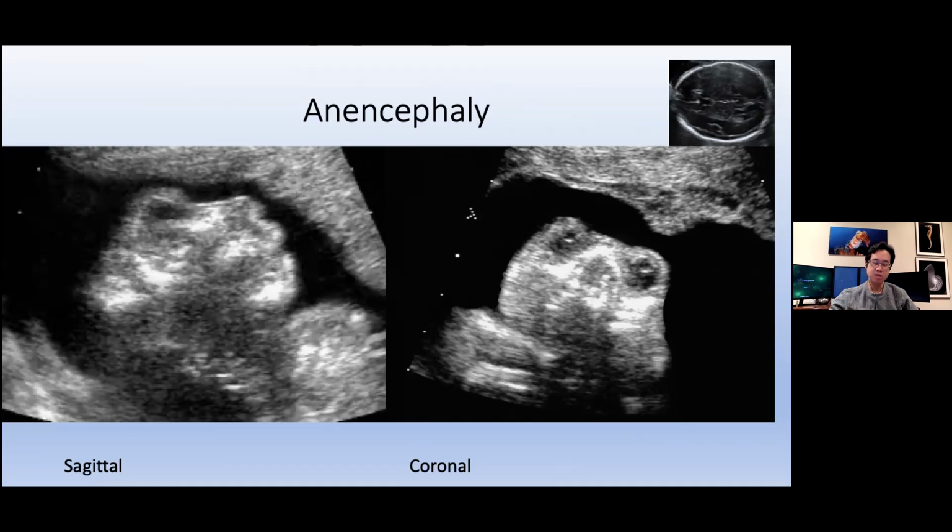So the absence of a mineralized skull beyond the 11-week mark is an indicator of possible anencephaly. You just do not have the normal cranial vault. And so the brain and the neural structures are exposed to the amniotic fluid, and that is very damaging to the neurologic structures, and often it regresses. So you will see this kind of frog-like appearance of the fetal head.